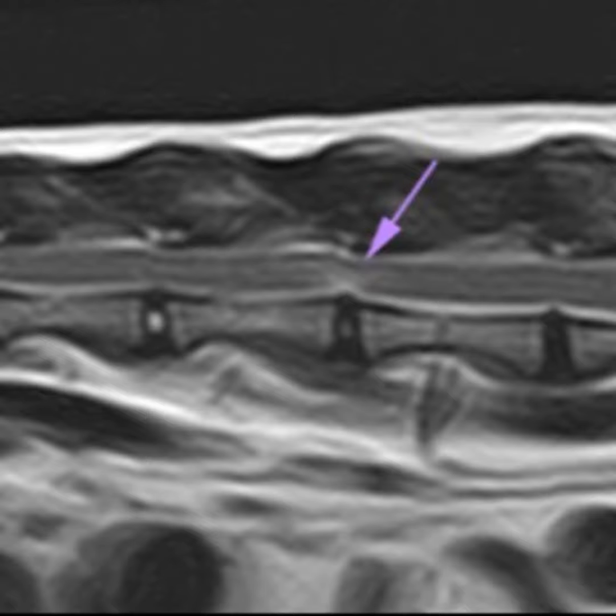Simon, I don't know if you have any question. Yeah, just on that subject, the acute non-compressive nucleus pulposus, you mentioned in the paper that you use the Spinal Cord Injury Consortium classification. Would you be able to expand a little bit on the criteria that you had for the acute non-compressive versus, how you gained some confidence that it wasn't a fibrocartilaginous embolism, for instance? Does that make sense?